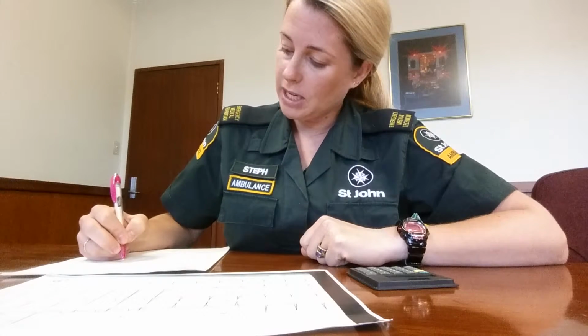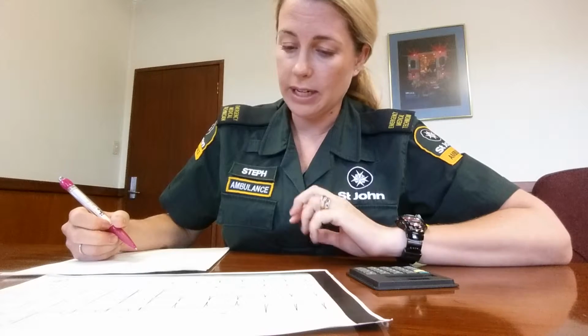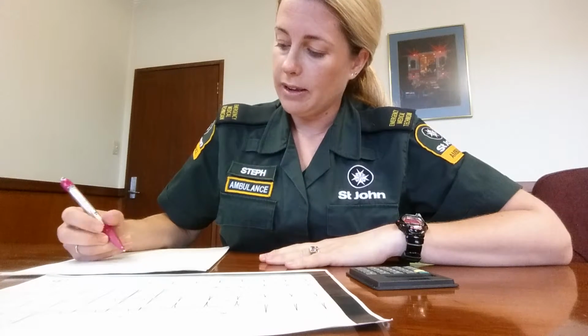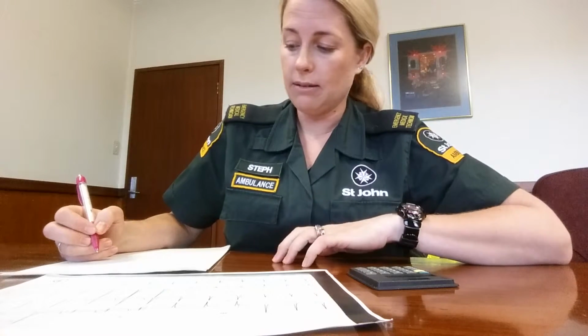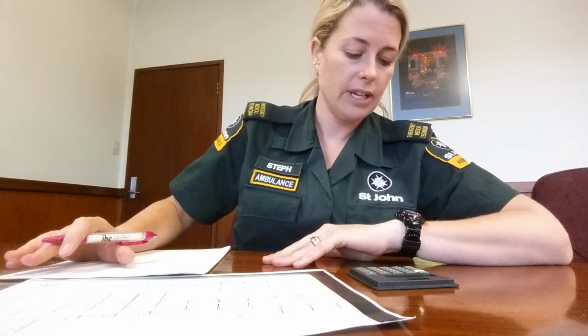So interpretation would be normal sinus rhythm with Wolff-Parkinson-White and left ventricular hypertrophy. And I guess you can always rule in a mimic, but you can't rule out a STEMI. So check on those, have her see a doctor, and have a look at the posterior ECG.